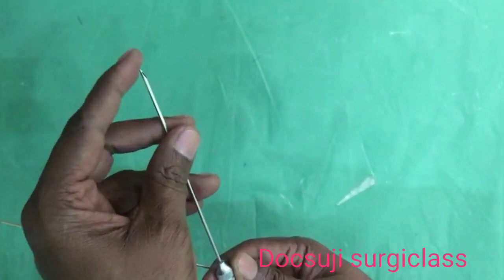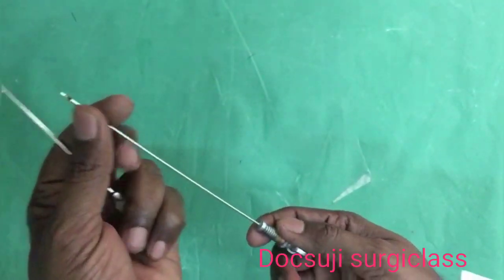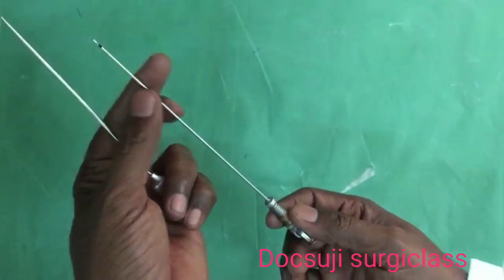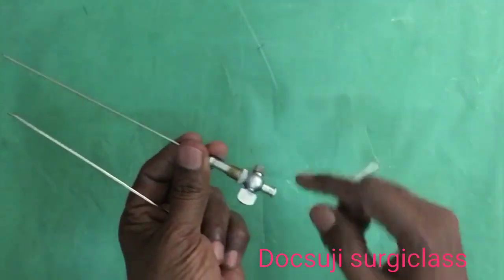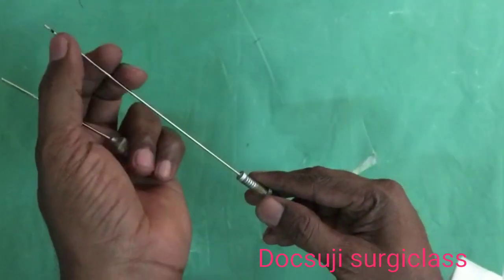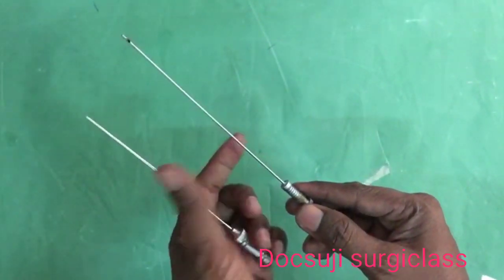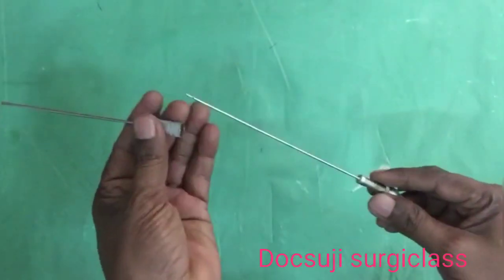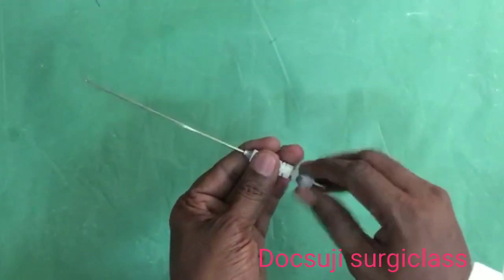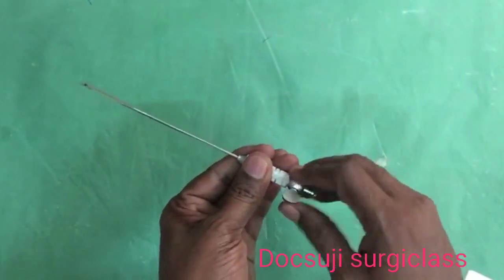Whereas the inner sheath is a blunt one, and a small subterminal hole is also there through which carbon dioxide comes out. And this is the port where you can connect the carbon dioxide tubing. That is the hole through which carbon dioxide will enter into the abdominal cavity. So you have to lock it and insert the needle to create the pneumoperitoneum.